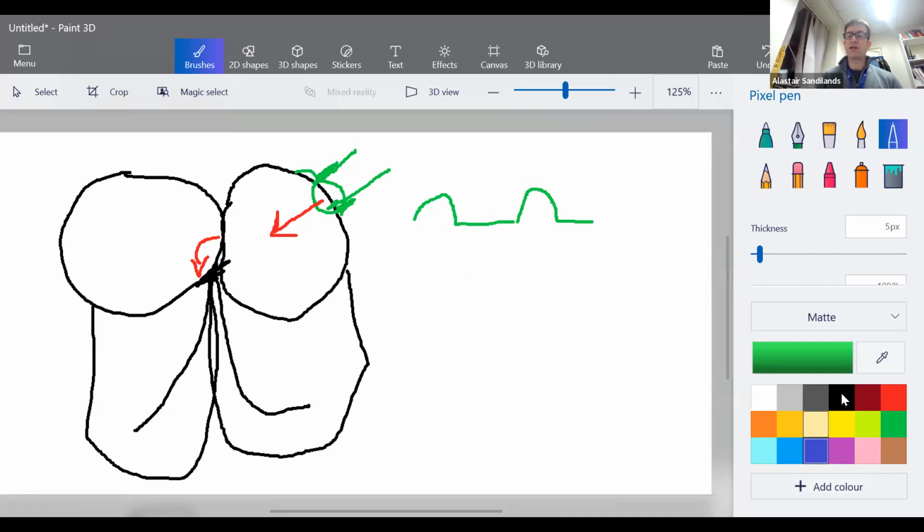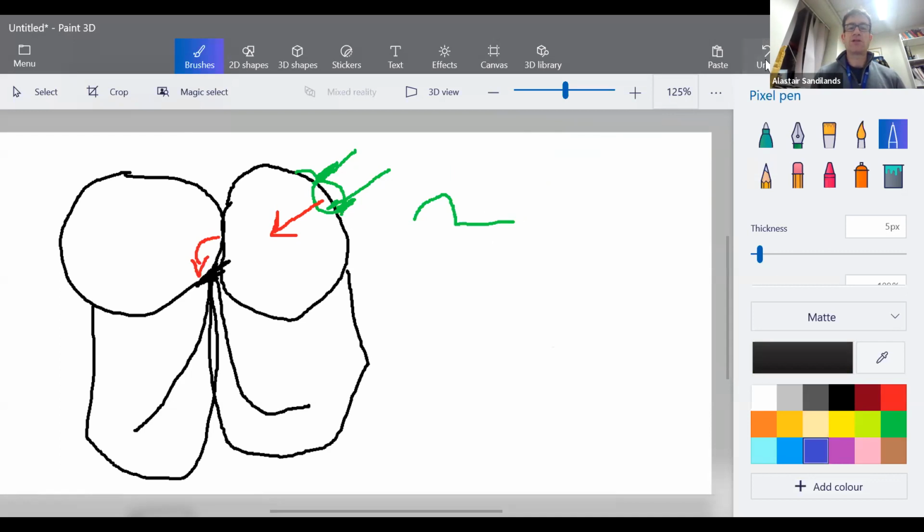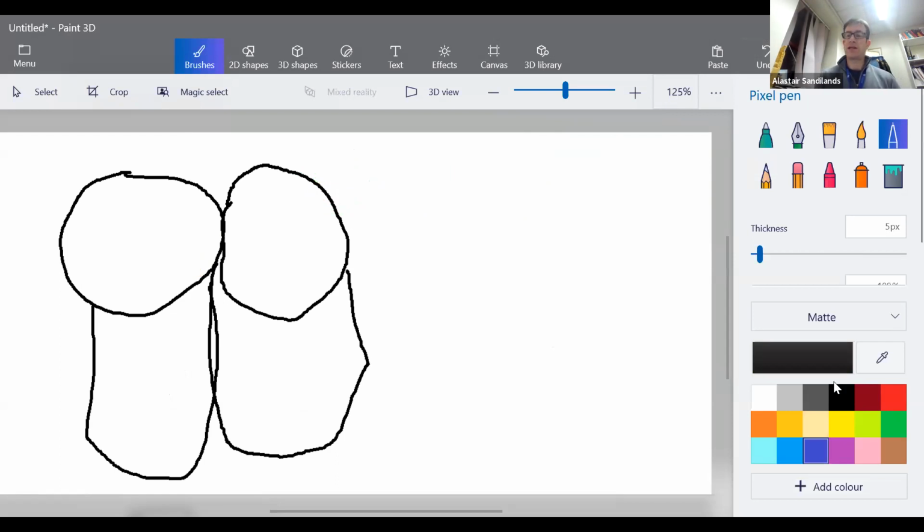So we have to then superimpose our QRSs again on here. So this is evidence of our atrial activation, our focal P wave, discrete, it's not continuous or fluttery, and then conduction down to the ventricles, which is generated by our QRSs here. So that's an example of an atrial tachycardia. So in atrial flutter and atrial tachycardia, the rhythm will be regular.